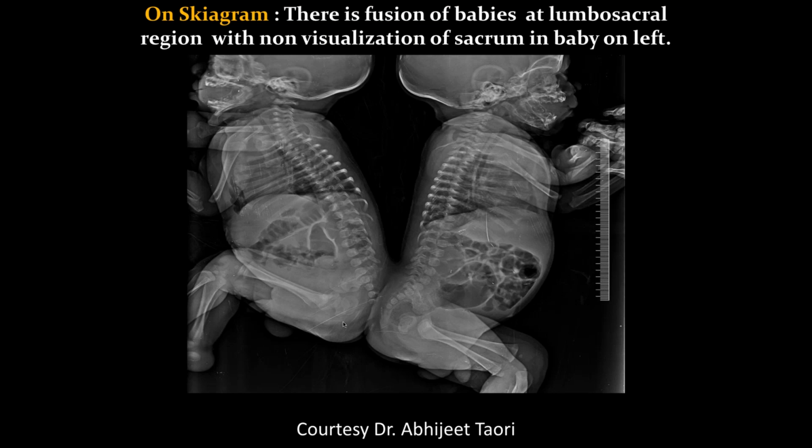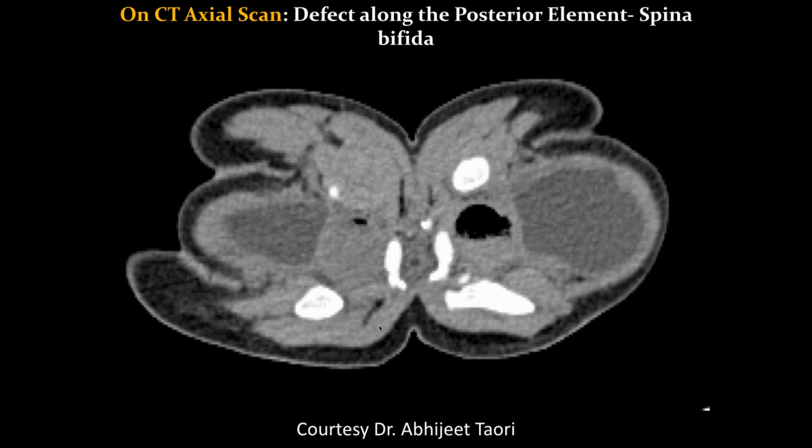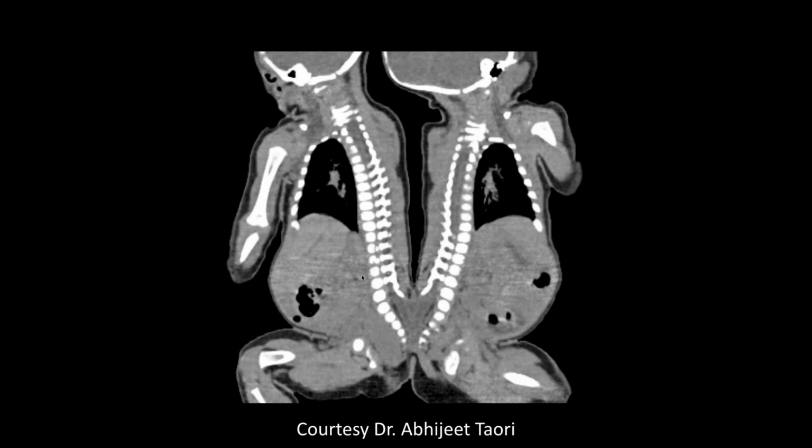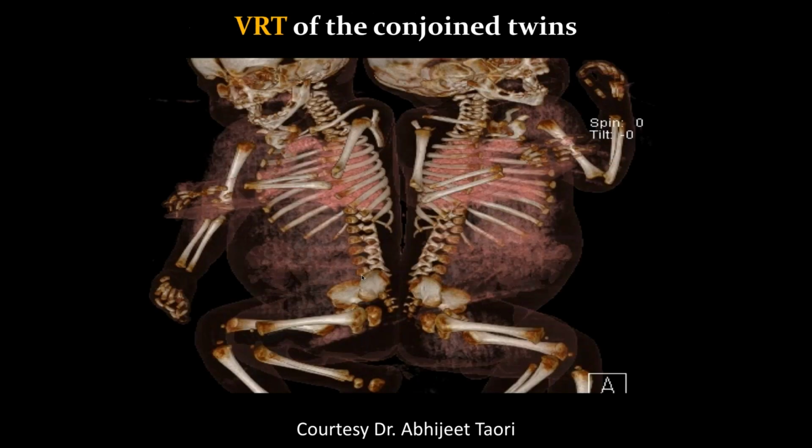So there's no sacrum on this side, but you see a sacrum on that side. And then if you do the CT scan, what do you think this shows? So those are urinary bladders, I guess, with fluid in them, and then you see two separate sacrums. Yeah, there. Oh, so this actually looks like the canals are fused. Yeah, it's getting worse as we go on. This doesn't help as much, I don't think.